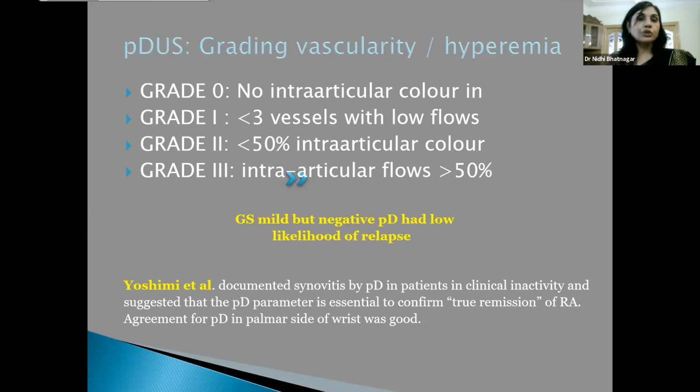Coming to the power Doppler ultrasound, which actually is the mainstay of evaluation in rheumatoid arthritis, because Doppler ultrasound allows detection of the perfusion of synovial tissue in inflammatory disease. The presence of Doppler signals represents a prognostic criterion for development of erosive disease in rheumatoid arthritis, which has been defined by OMERACT. So when we're talking grade 0, we're saying there is no intra-articular vascular signal on power Doppler, but there will be synovitis on grayscale. That's why we put the power Doppler there.